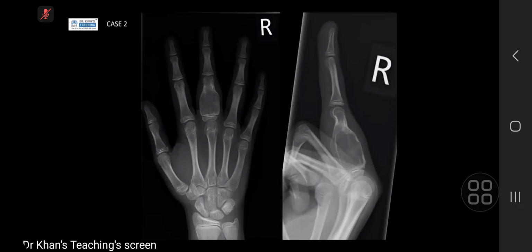Okay. So I would agree doing an MR would be helpful if the patient were having symptoms. Enchondromas are fairly common. I wouldn't suggest doing an MR for every enchondroma that you see. But that was really well presented, really nice. You would hope that if you were given an exam case like this, the case would have that very typical ring and arc chondroid matrix. I've given you a bit of a tricky one, but you handled that really nicely.